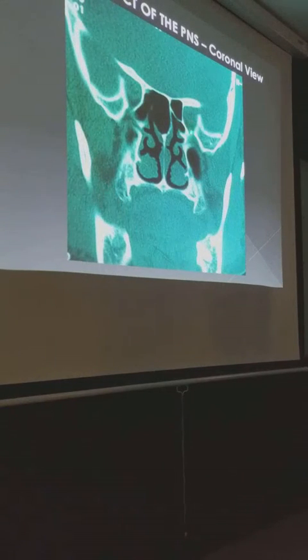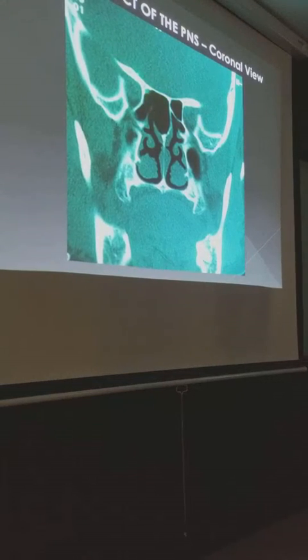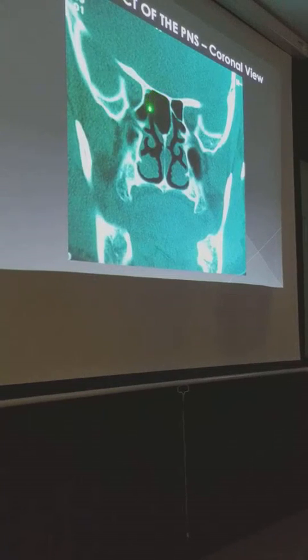Okay, here, again, right? Definitely you are in your sphenoid, because you already see your anterior clinoid process. This is your cavernous area right here. Okay, so this one again is a question mark. Is this an Onodi cell? And this is just the sphenoid, agree?